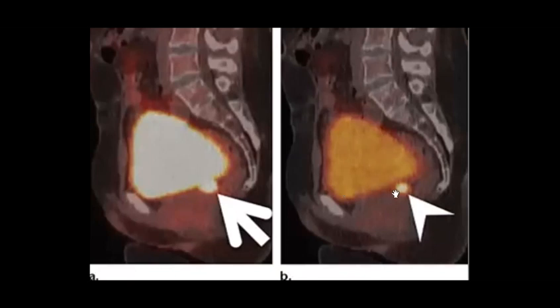Do you still agree with this answer, or will you change it? They mention that in the delay image, it goes to 15.